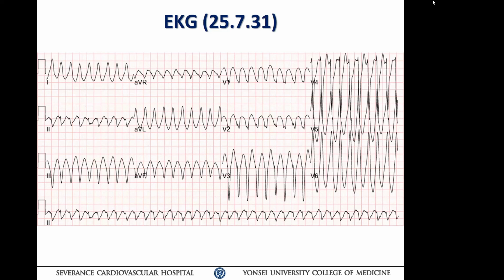Okay, is it RV or LV? So two people show completely opposite opinions. So usually we look at V1 to localize RV or LV, as the ECG always goes from the negative wave portion to the positive wave portion. But if there is an early transition at V1 and V2, probably it comes from the septal area. But in this patient, the transition is V4-5, right? So I guess this VT or SVT with aberration is coming from the right ventricle.